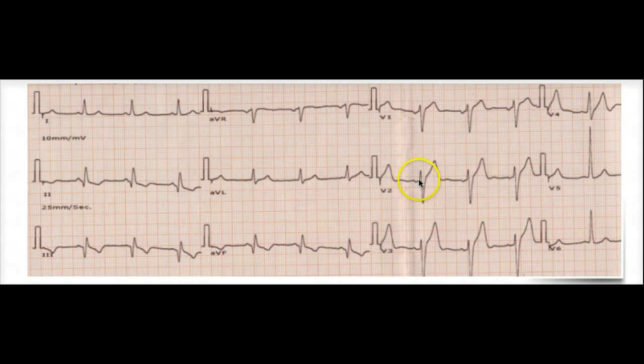Sometimes we don't even see Q wave. We don't really see Q wave here. This is R, this is really S wave. So don't get confused whenever you see a negative deflection. Q wave has to be the first negative deflection. So, is there any Q wave in this ECG at all?